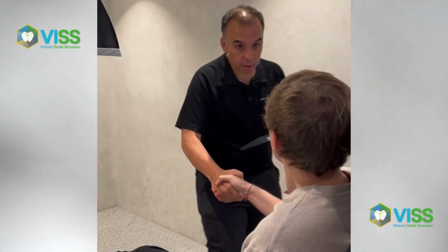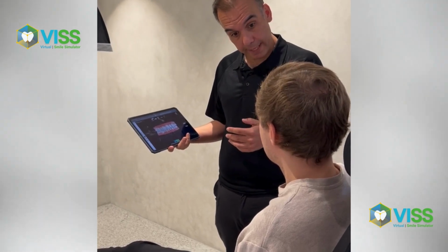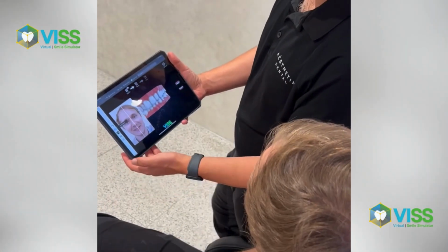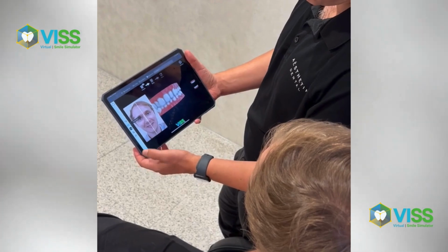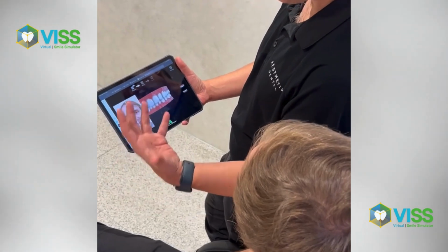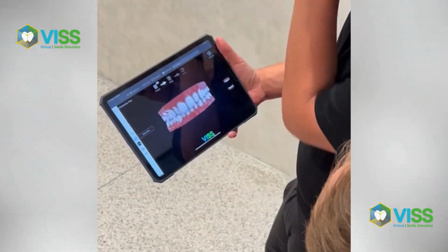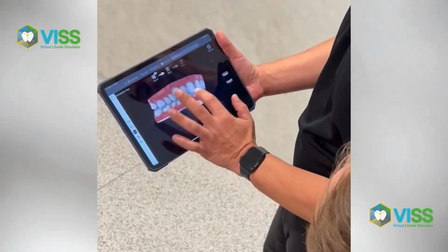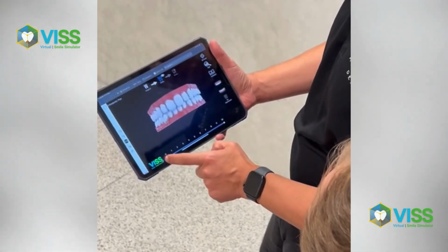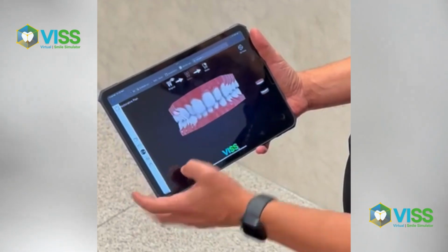Welcome back, Ryan. You excited to see your smile transformation with Virtual Smile Simulator? Yes. Right. Do you remember last time you saw us, we used Smile Geni, an AI smile transformation tool to show you how we can enhance your smile by broadening your smile, straightening your smile, widening your smile, and also improving the shape of your teeth. Now we've taken all the photos and the STL file scans that you had done to be able to show you how we're going to improve your smile by showing you what the orthodontics would look like with the clear aligners, showing you what veneers would look like.